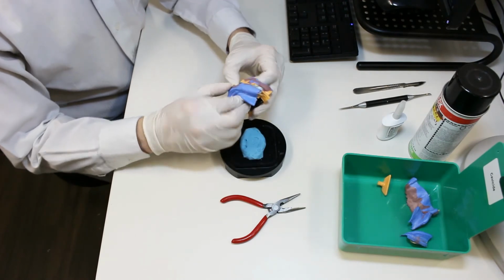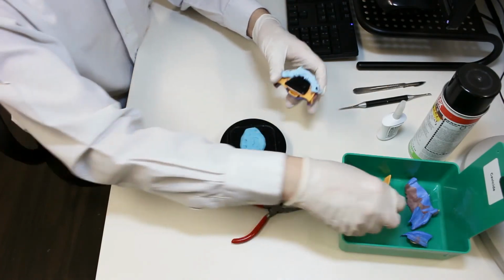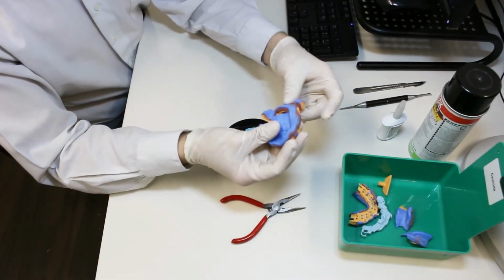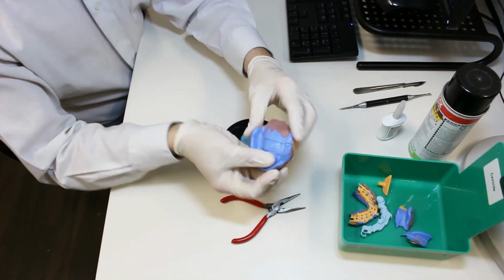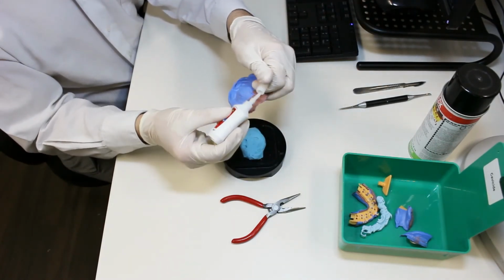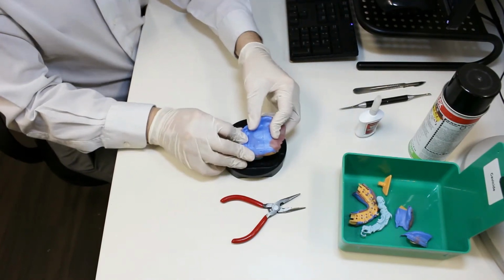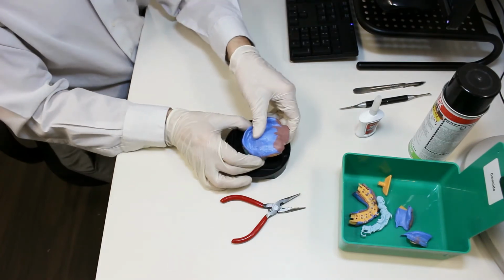For the upper scan, separate the bite and the lower tray from the upper tray and attach the posterior attachment carefully, not to harm the impression. Once attached, please glue it with super glue, ensuring all edges match properly. And if you see any bubbles or areas, just cover them with putty. Now make sure to place it at 45 degrees.